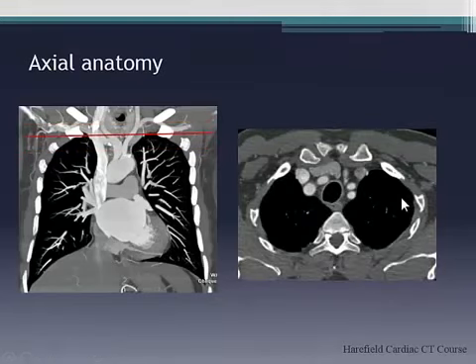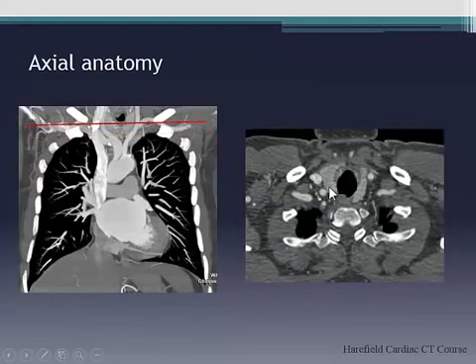Okay, so as we're going up, for some reason, sorry, these are Taryn's slides. As you head north, the brachiocephalic splits into the right common carotid and the right subclavian. The subclavians stay the same, and what you'll see here is the brachiocephalic staying separate. Okay, higher up, you'll often see the thyroid, and the thyroid traditionally has high attenuation because it's got loads of iodine in it. So even on an unenhanced study, it will look bright, and it's just the iodine which is what's in contrast. And obviously you'll see the common carotid eventually splitting into the internal and the external. The vertebrals will come off the subclavian, so you'll sometimes see the vertebral arteries and the subclavian arteries. And similarly, you'll see the jugular veins.